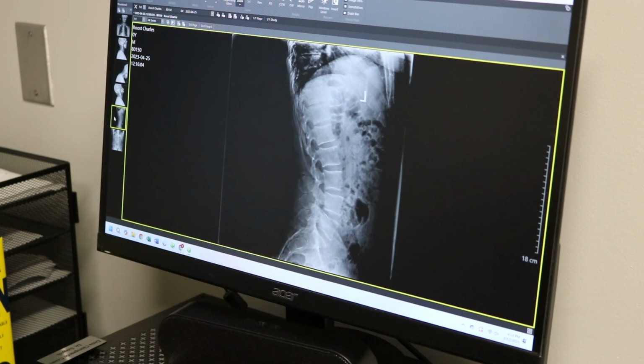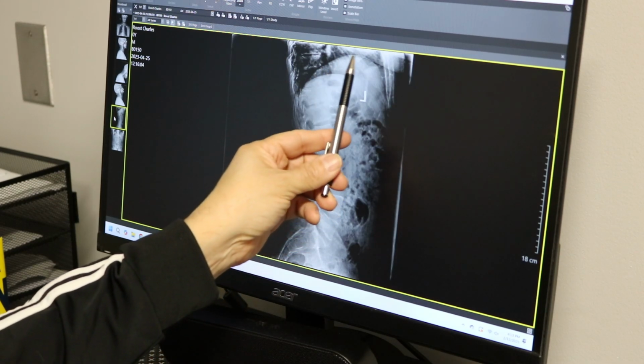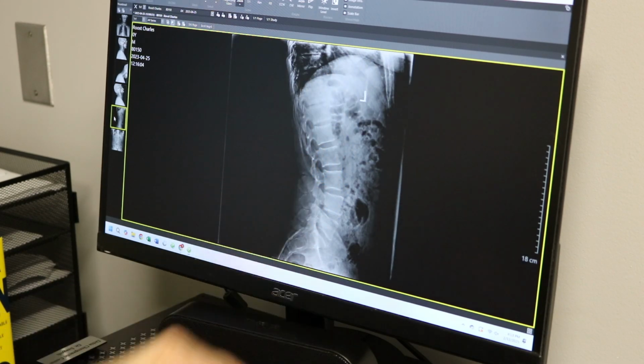Point out the top of the diaphragm. That kind of stands out. Yeah, it's going to be this little line right through here like so. Gotcha. So above that is my lungs. Yes. Below that is my stomach and guts. Absolutely. All right. Thank you so much.